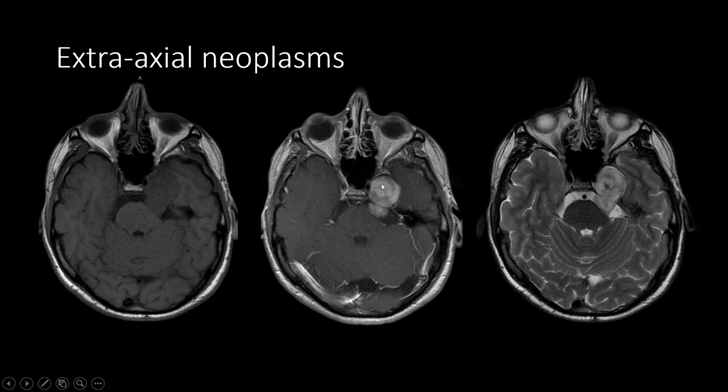This is an example of a trigeminal schwannoma, this lobulated circumscribed mass extending into the prepontine cistern and the Meckel's cave and cavernous sinus, compressing the internal carotid artery medially. We see again avid enhancement, though inhomogeneous, heterogeneous but predominantly high signal on T2-weighted imaging.